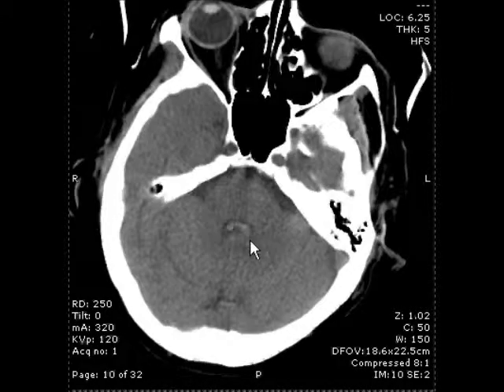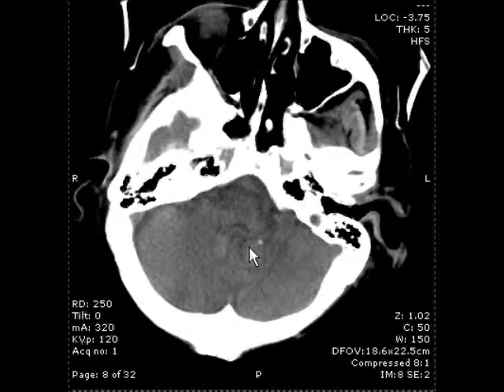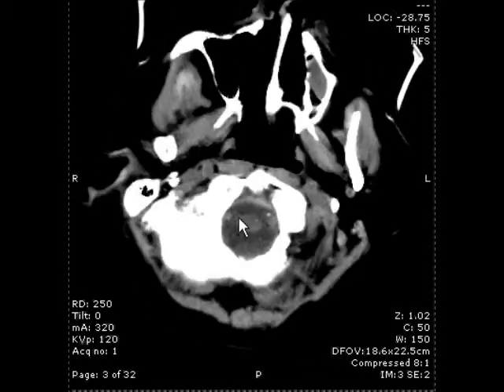of hemorrhage here in the fourth ventricle. You also have choroid plexus here as well, but you follow that ventricle, and then out laterally you've got the foramen of Luschka out here laterally with CSF seen there. Foramen magnum, which you can see CSF in.